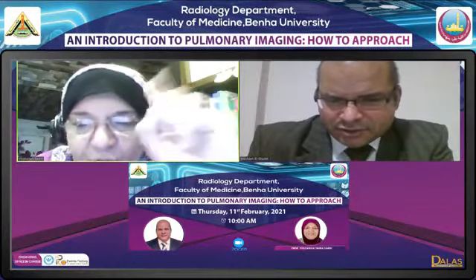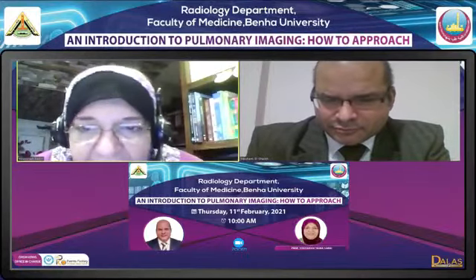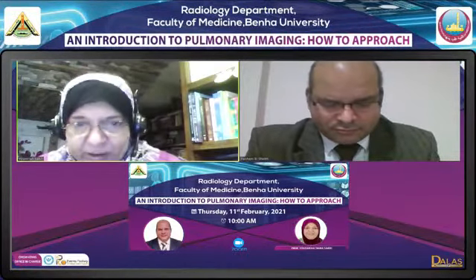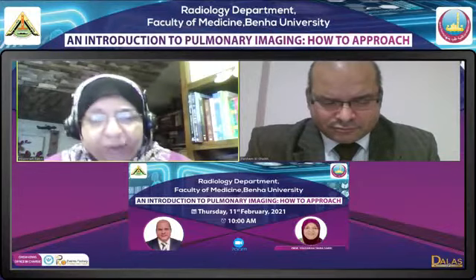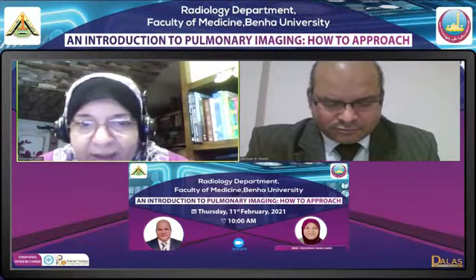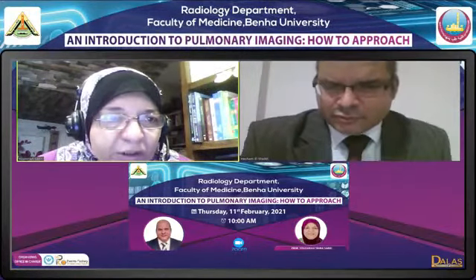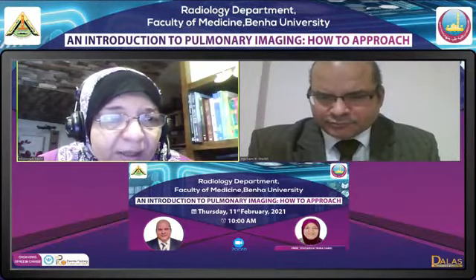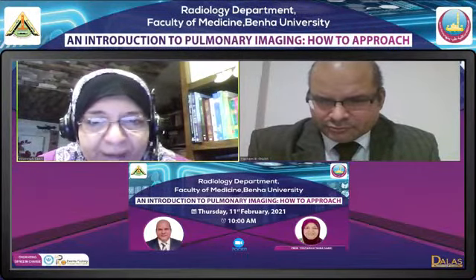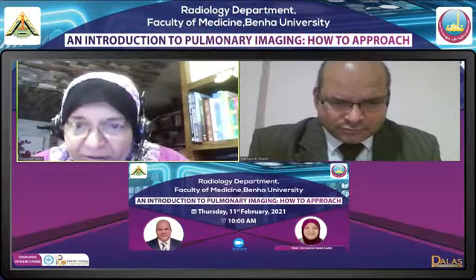فأنا عندي predominant blackness أولا، مش predominant white lesion، يعني أنا عندي خروم أكتر من الأبيض. ده حاجة، والحاجة إن ده شد الميدياستاين. لما نيجي للي بعده، هل أنا عندي هنا ليجن أبيض في أسود تمام، والليجن الأبيض في أسود ده شد الفيشرز، بقى سيكاتريشال كولابس. يبقى ده اسمه سيكاتريشال كولابس برضه. والدليل على كده إن احنا لما جينا نوصف هذا الليجن هنا، قلنا إن أنا أدي ده سيكاتريشال كولابس عشان شد الحاجات، ونفس المنظر اللي تاني بالظبط لكن عمل ماس ايفكت تمام.